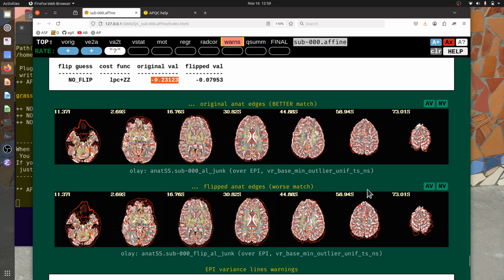That's the fingerprint. Here, I mean, it's an alignment algorithm, so it tries to do what it can, and even the ventricles look pretty good. And so you might think, well, maybe it is, but again, the hallmark signature of where left and right in humans are more individual and less symmetric is really up here, and it really looks like kind of a spaghetti mess versus here where it's tightly coupled in here.